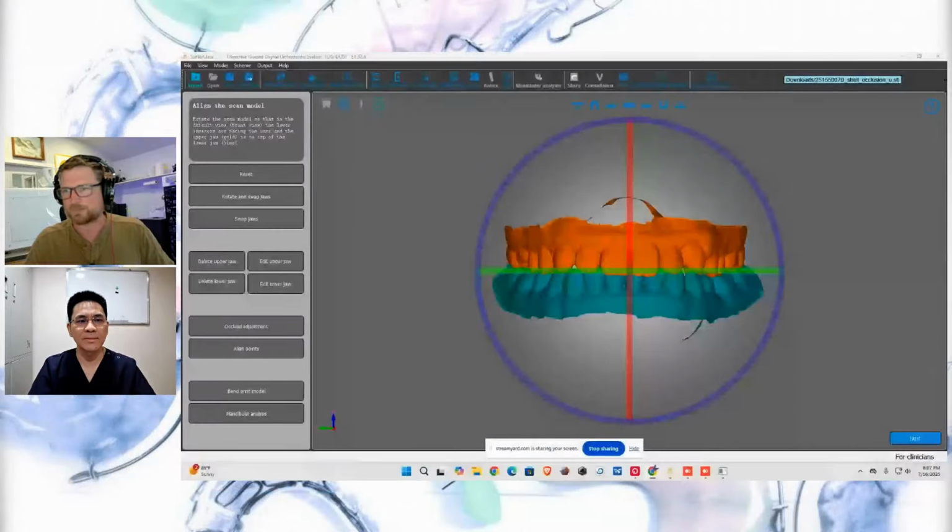But he's going to be there to tell me when I'm doing something wrong, because I'm still new to this software and still learning it. And he's the one that pretty much designed this with help from your developers. So this is the first screen, and if I click, oh, you can't see it because I don't have it pulled up. There we go.